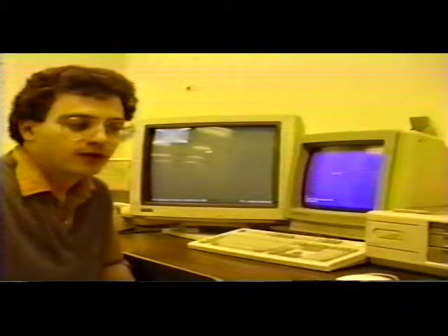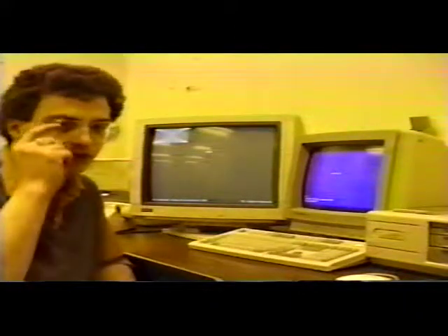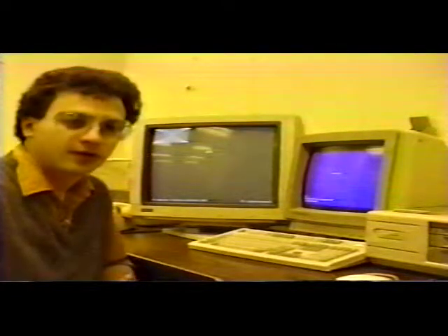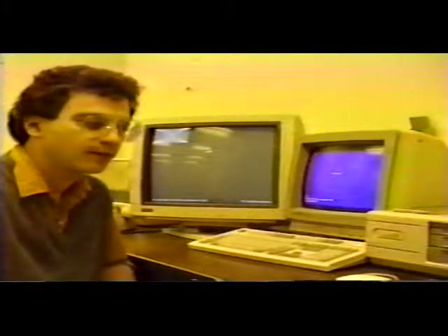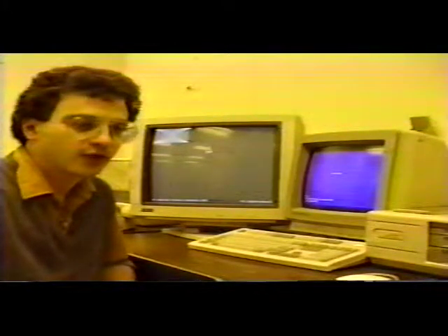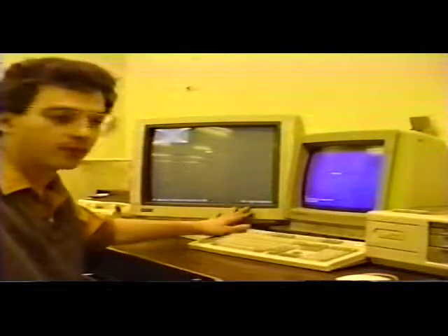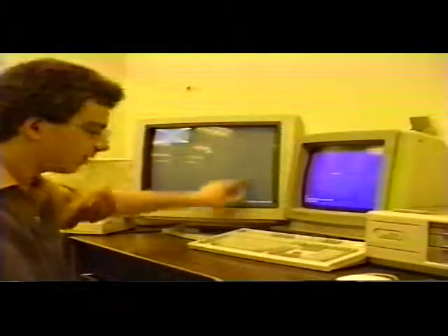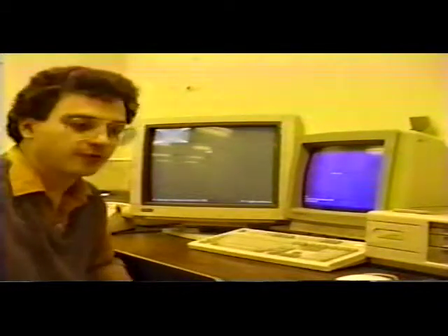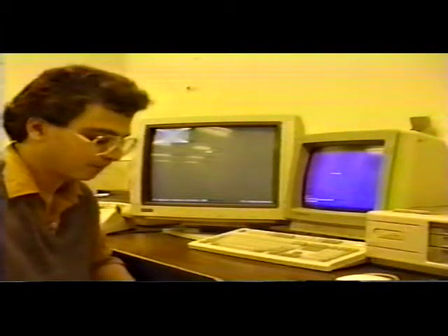The idea is to store information on the card by patient, and the system is a compact 386S running at 16 megahertz. Now it is a 386, but we're using it in 286 mode. It has a Laser Magnetic Storage International write-once optical disk drive, a color screen, and a black and white screen, which has 1280 dots across, 1024 dots down. It's being driven by a card manufactured by Number 9 Systems, a small company in Cambridge.